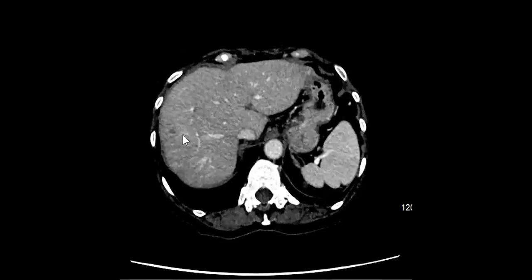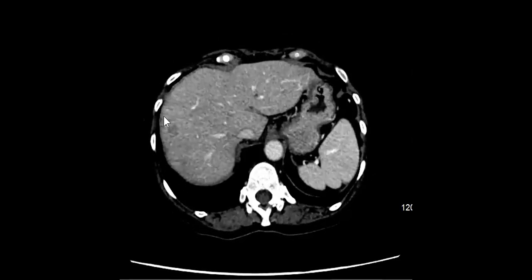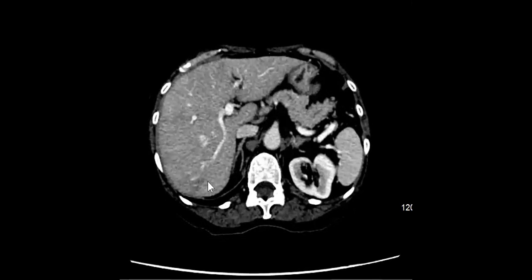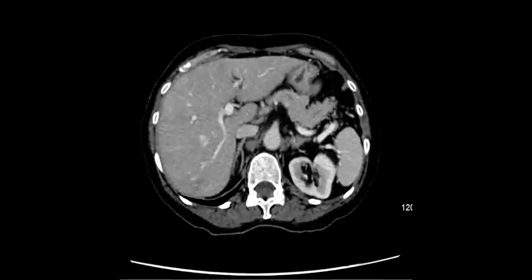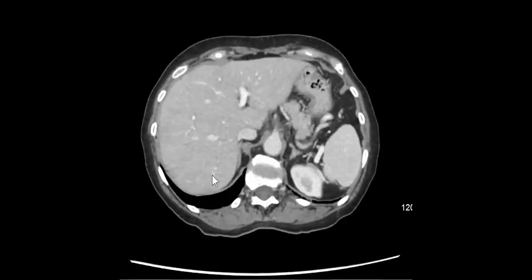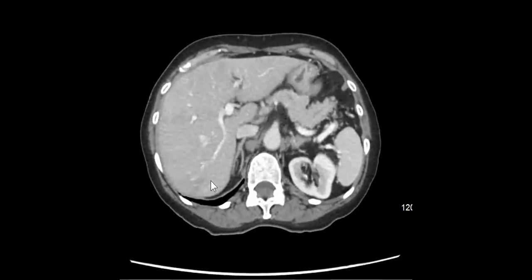And this was noted, right? This is a new lesion, appropriately thought to be a metastasis because it was new. And then there was this kind of vague heterogeneity on CT here, and the person who read it wasn't sure if this was also present on the prior study, or if it was another metastasis or what was happening, so they recommended MR.